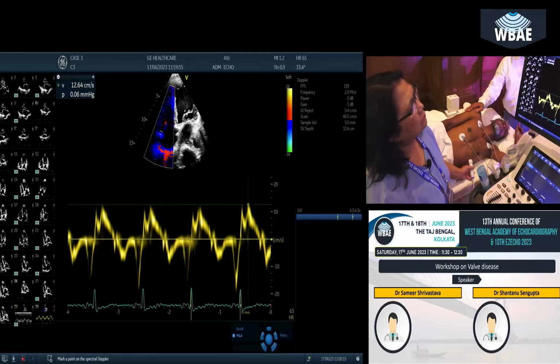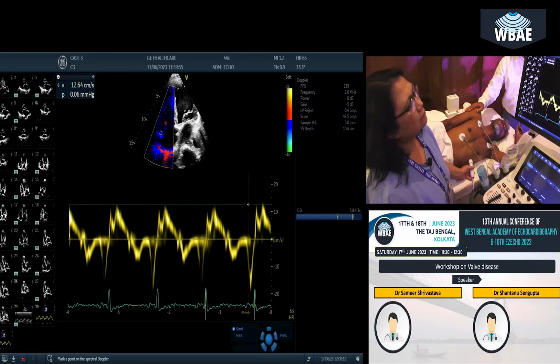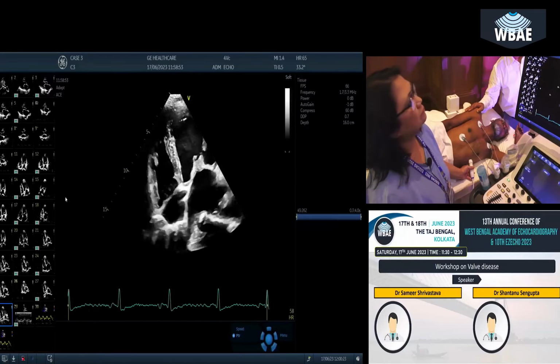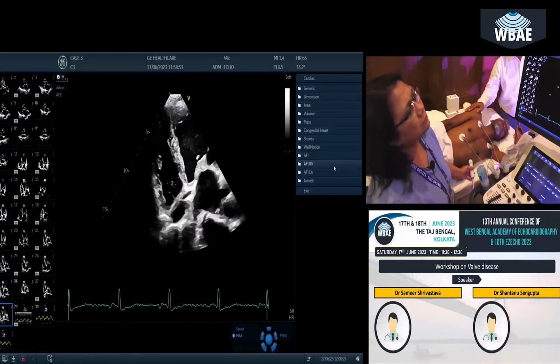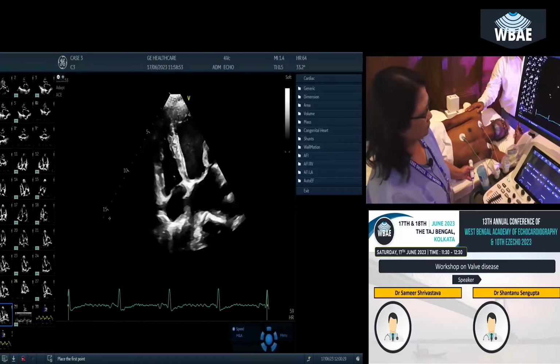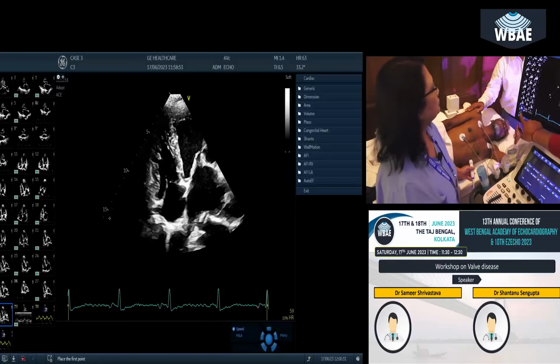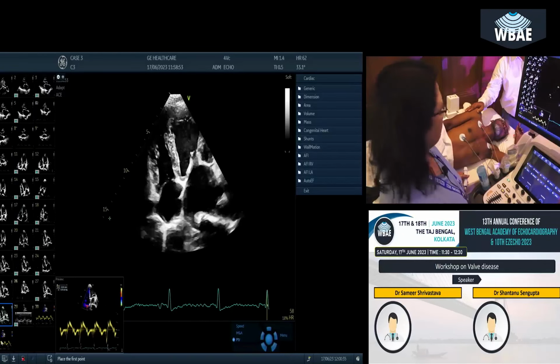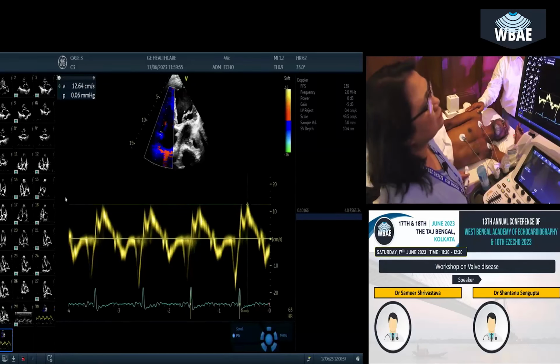Because this spectrum is wide, where exactly should we measure? Can you show it back? Can you get it back again? Same recorded image. Image 31, please. Recorded picture. Yeah, sir, you have a pointer.